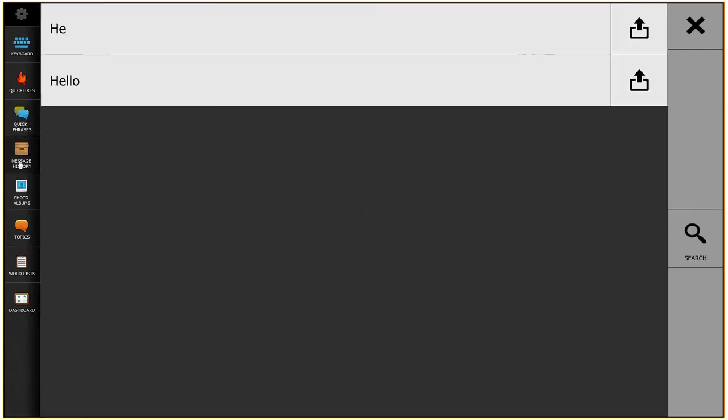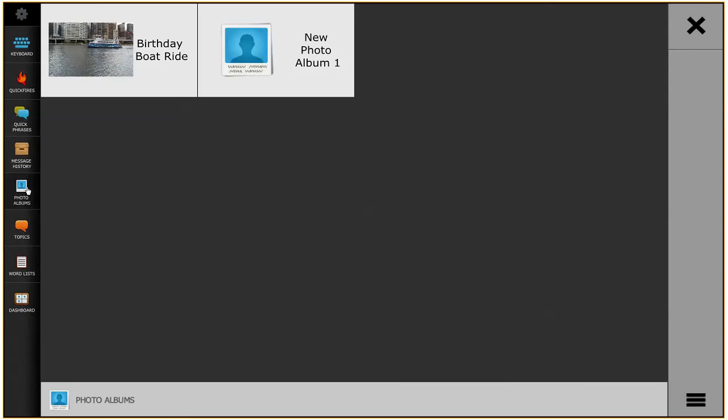Message history, these are all the things that I've already typed. So if I want to choose to, I can. A photo album, you're welcome to put photos here that you want to tell people about different things, a trip you went on, anything like that.